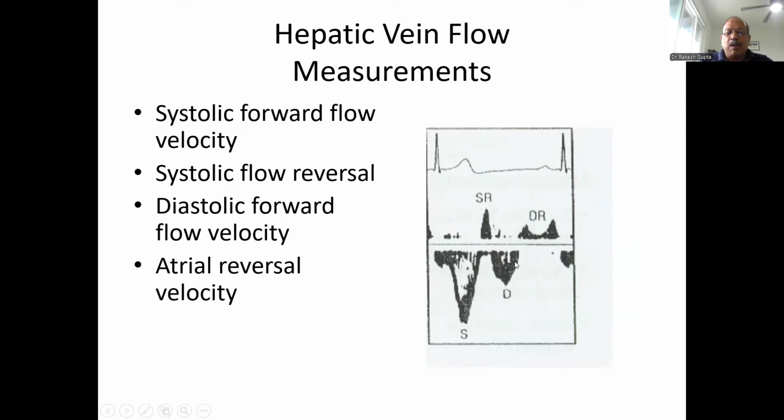During the cardiac cycle, all flow would be in the same direction. Okay. So then what are SR and DR? Don't look at that because it'll get confusing. Suppose you've got significant tricuspid regurgitation.